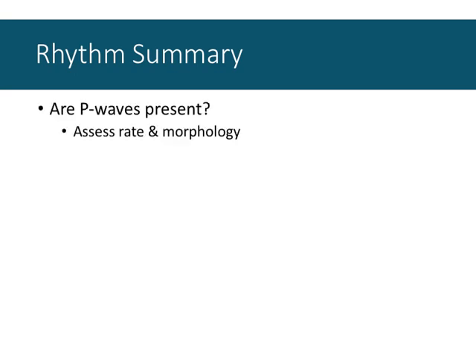So I always look, one, at the P waves themselves. I ignore the QRS complexes. Are they there? If they're there, what do they look like? Are they always shaped the same? Do they have the same amplitude? Are they peaked? Are they rounded? Are they notched or bimodal? Are they biphasic? Do they go above and below the baseline of the ECG?